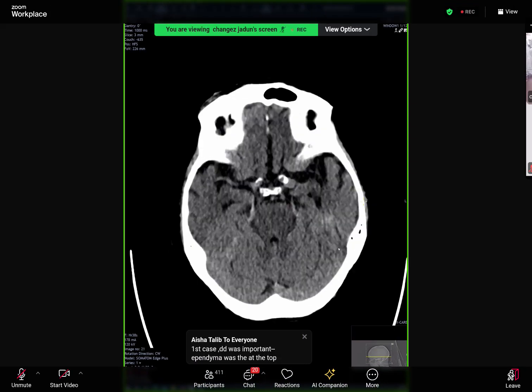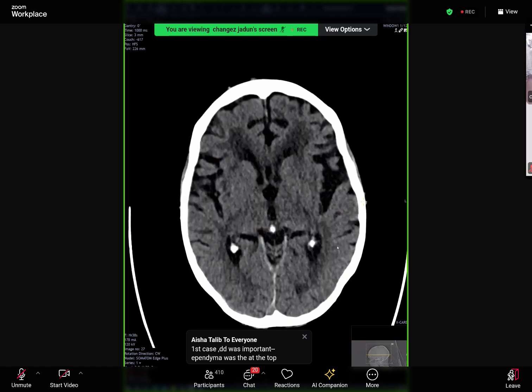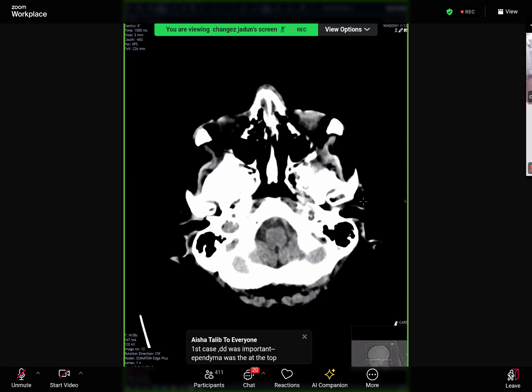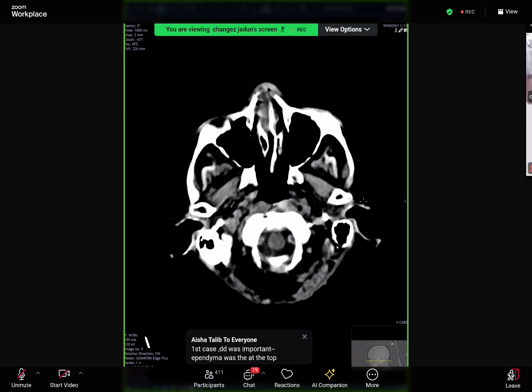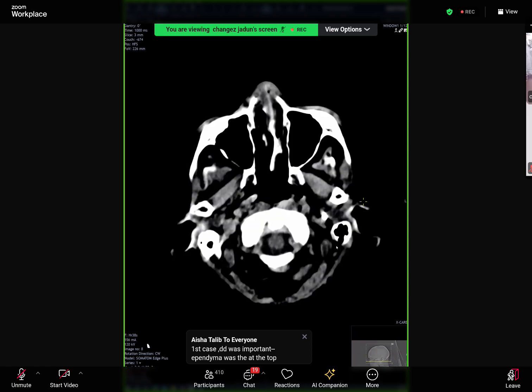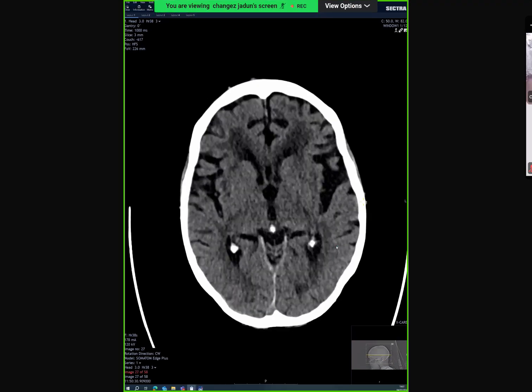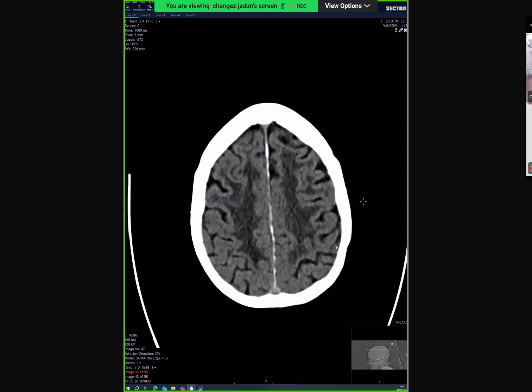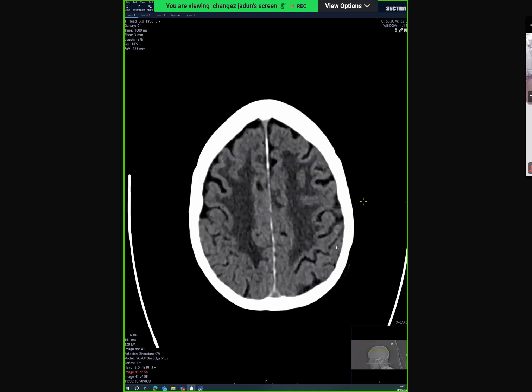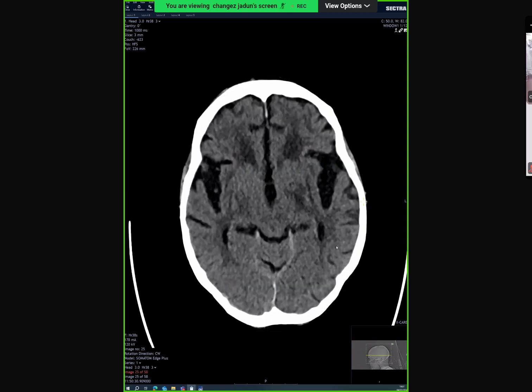Okay, sir, if you can come down. Good. You have started to look at the basal sections, foramen magnum. Yeah, in the basal sections, I don't see any significant finding in the brainstem area and in the orbits. Carry on. There's definitely pronounced hypodensity in the white matter regions in this patient.